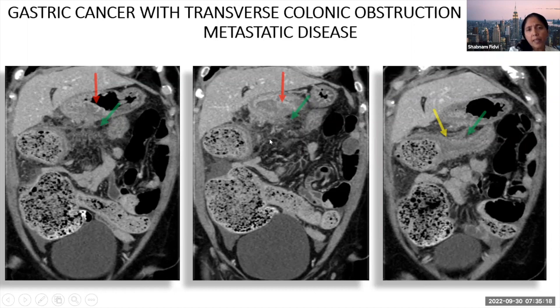Again, this is the patient with serosal metastatic disease causing a malignant large bowel obstruction, the primary being gastric cancer. You can see that the upstream colon, predominantly the right colon, is significantly distended with fecal content, and there's dilated fecalized lumen as well.